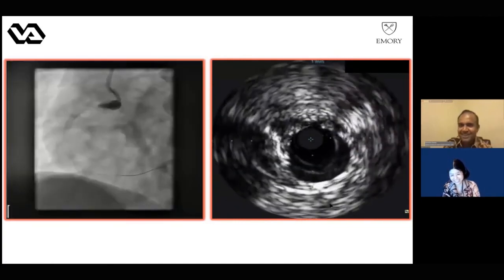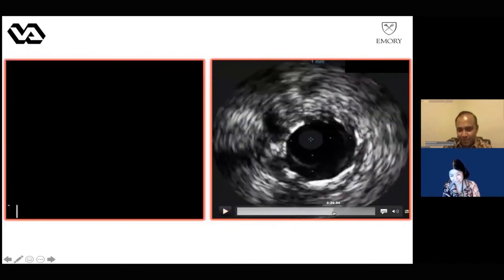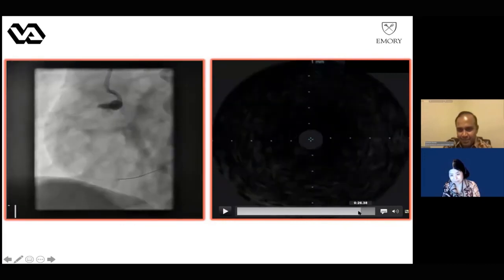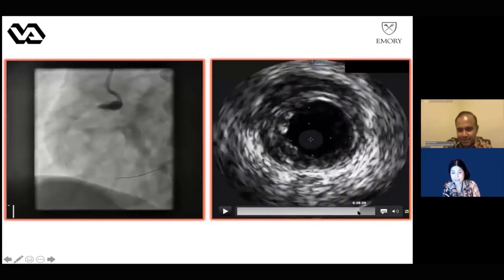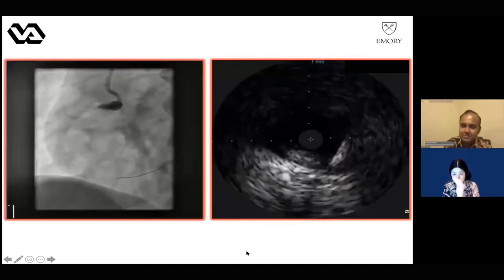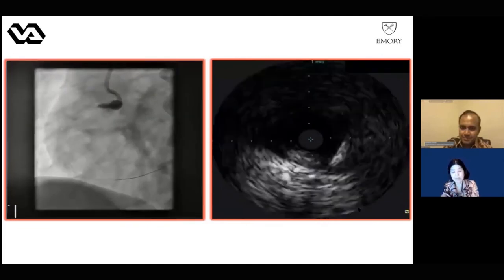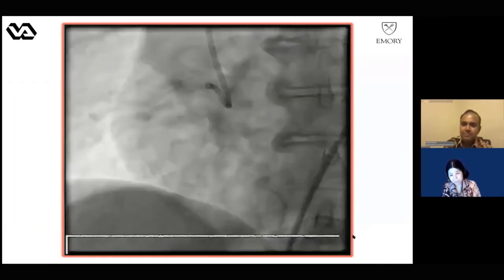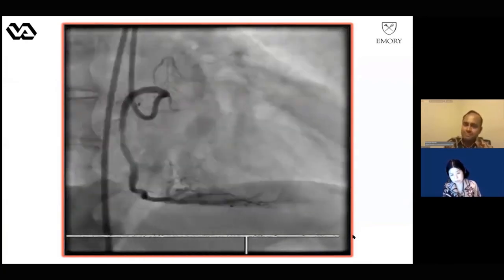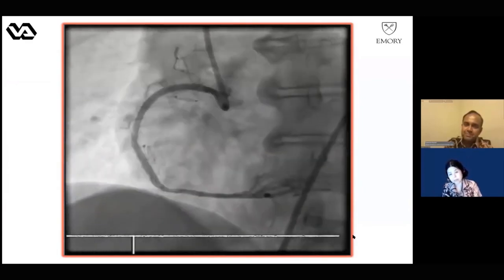Believe it or not. Let me see. Yes, this is interesting. Let me go frame by frame. Go to the very, very end. Yep. Okay. But I think it's okay, because as I said, typically the hematoma should have an entry side as well as a re-entry side. And I do think the entry side in this case should be the distal, because you made the dissection from distal to proximal. Therefore, I think you already covered the entry side.